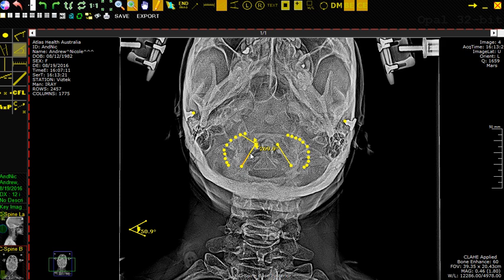So same thing, let's draw a line like this, and we're going to try to get it as close as we can to 90 degrees to the point that seems to intersect out this way. Okay, 90.1, again, I don't think I'm going to get much closer. Okay, 89.7, we're pretty good right there, and then this is just to finish off the estimate here.